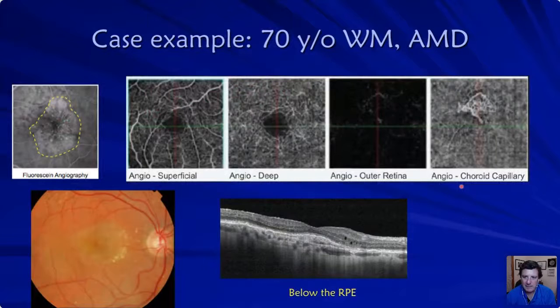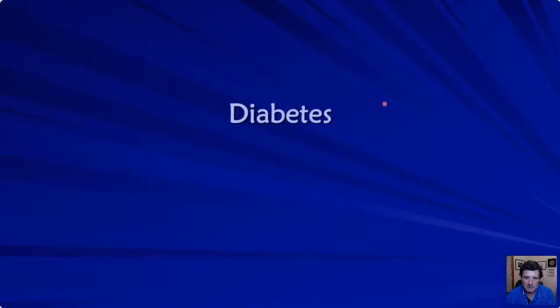And we just have examples time and time again. This is an exudative one. You can see the fluid that's occurring, but look how we can beautifully find this down in the choroid. It really hasn't broken into the outer retina yet, and get them off to the retinologist for a scan. Let me show you how this works in diabetes.